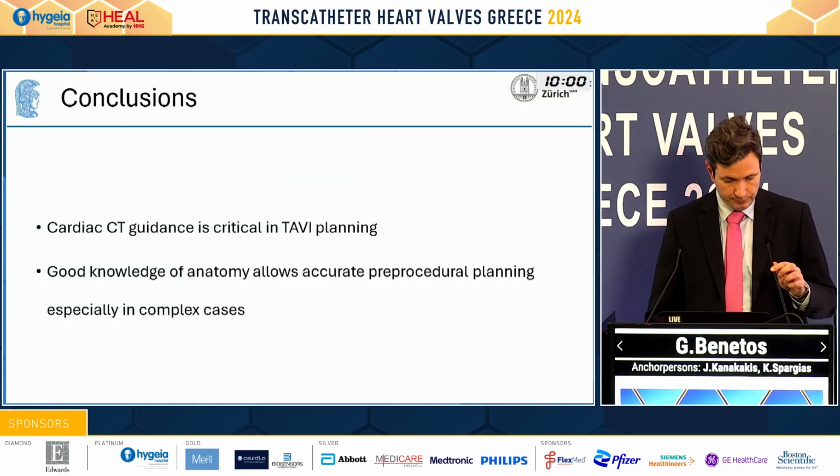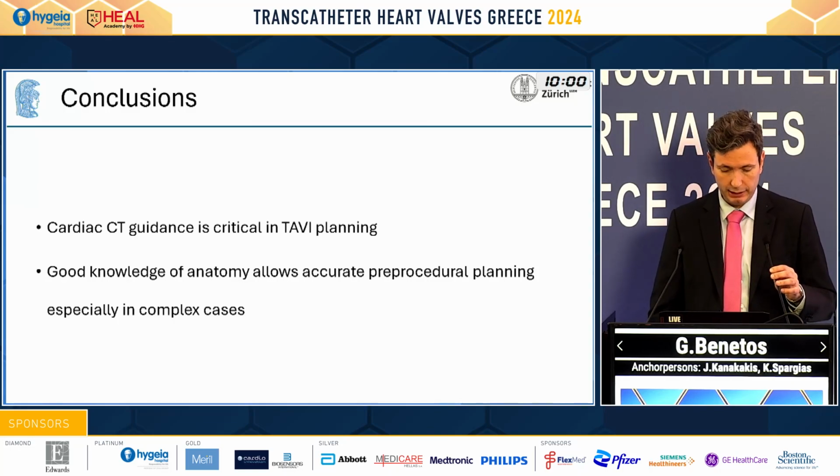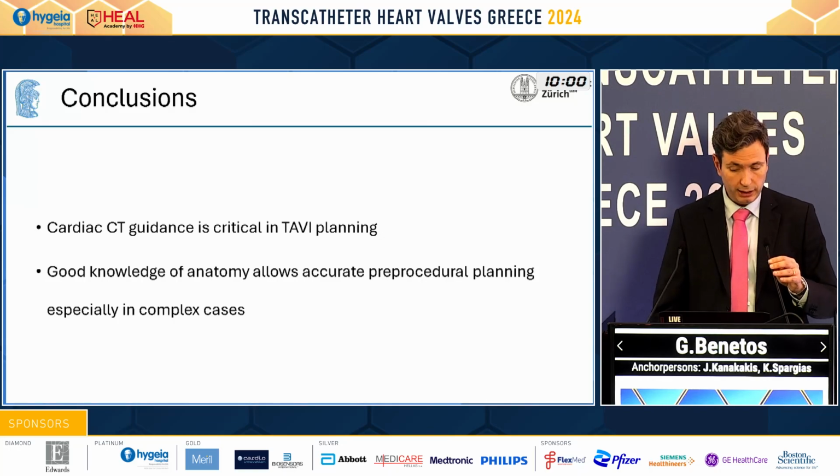In conclusion, dear colleagues, cardiac CT guidance is critical in TAVI planning. Good knowledge of anatomy allows accurate pre-procedural planning, especially in complex cases. Thank you very much for your attention.